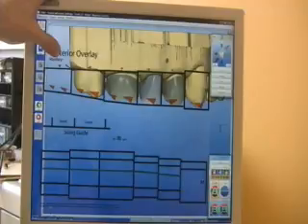And then we'll highlight the first premolar, widen it, and drive it back distally. Doing those movements, you can also see how the cusp tips of the buccal cusps are starting to line up with the triangles on the overlay.